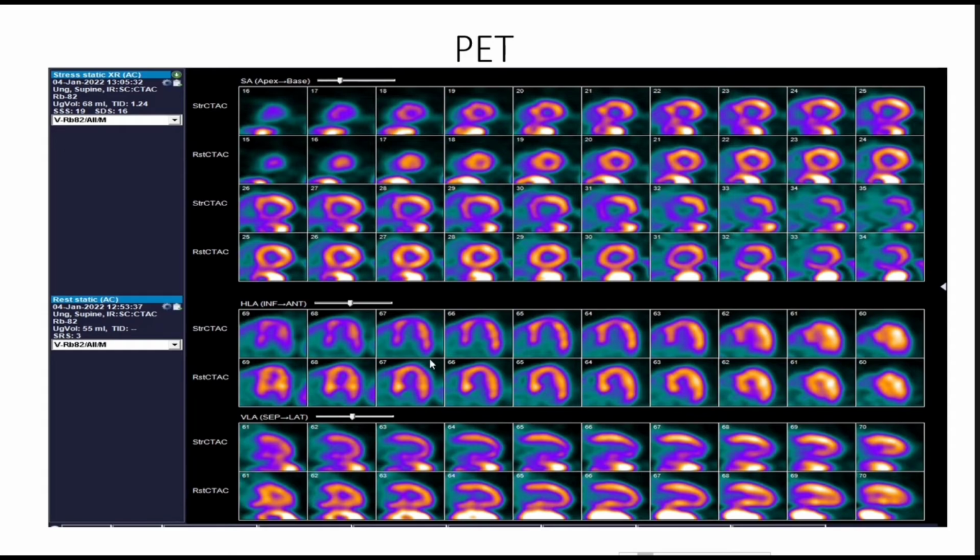It has to do with how much chamber is available. And so the inferior wall, again, this is a little difficult because his gut is in the way, but you can see that the inferior wall is affected with count reduction. You see that also up here, that it's predominantly the inferior wall that is affected.